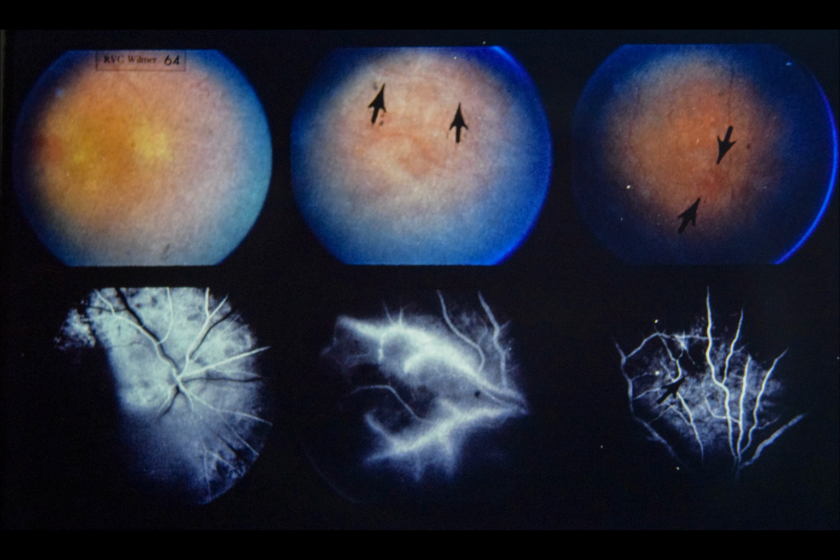This young man eventually developed a traction and rhegmatogenous retinal detachment, which was successfully repaired by a technique employing vitrectomy and scleral buckling. Presumably, multiple emboli of foreign material produced a diffuse retinal vasculitis that eventuated in multiple vascular occlusions with secondary changes as described.